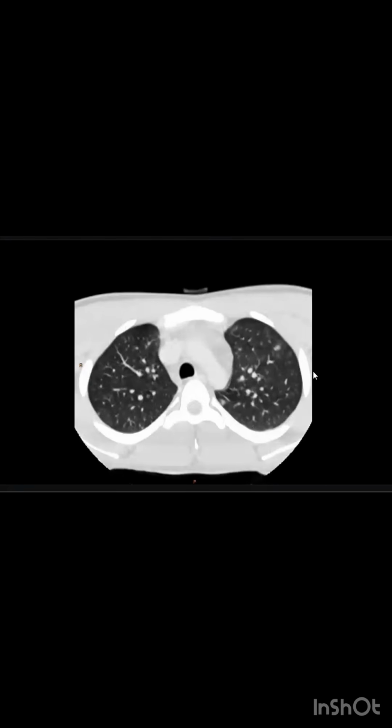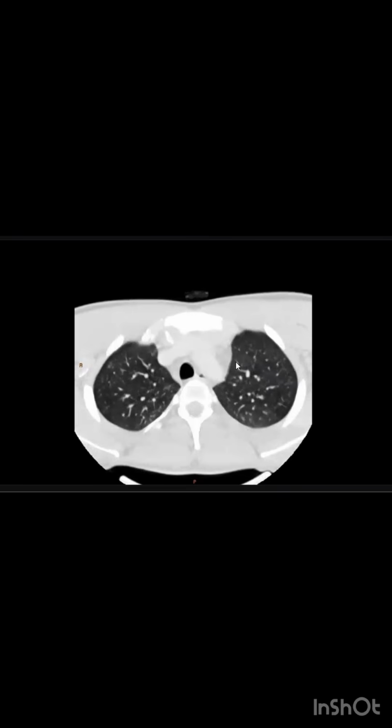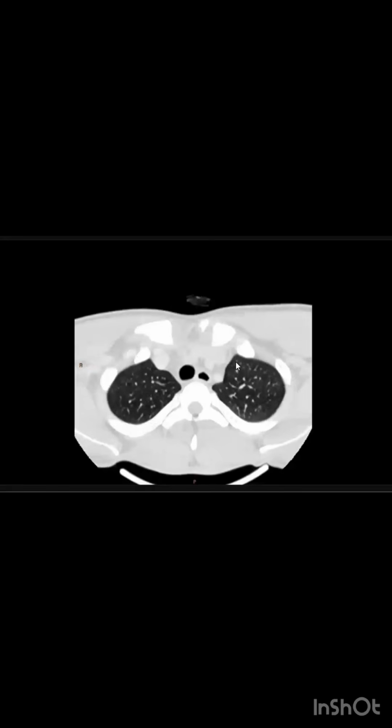There is a widening of the prevascular space. Ignore the mediastinum, just concentrate on the lung fields. On the lung field, yes, any complication?